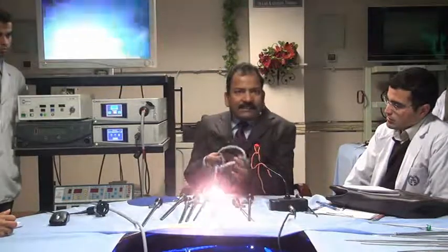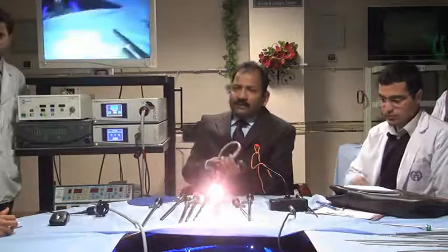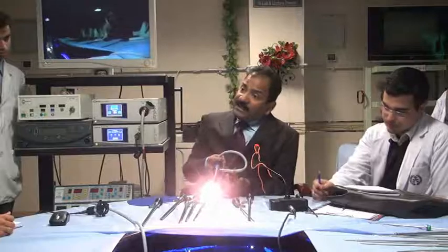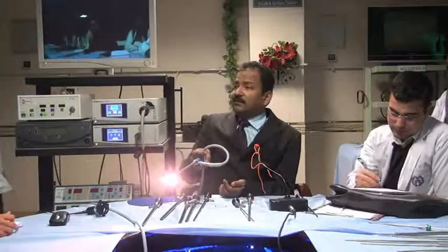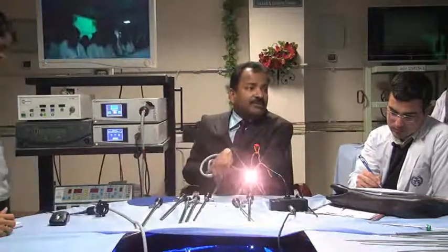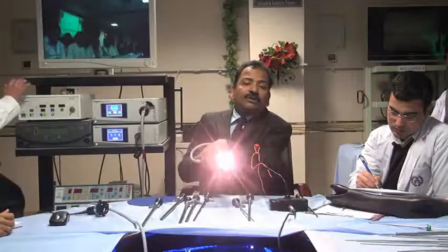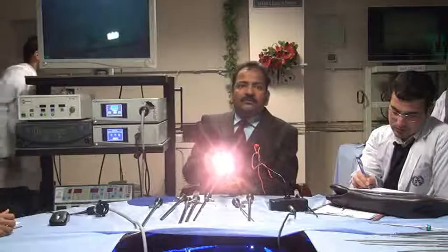And if I am changing the telescope only, I am changing my field of vision. But orientation is the same. Everybody is sitting upside down. Nobody is wrong. But if I have to see her, I will do it like that. If you have to see him, I will do it this way. If you have to see the stone, I will keep it up.